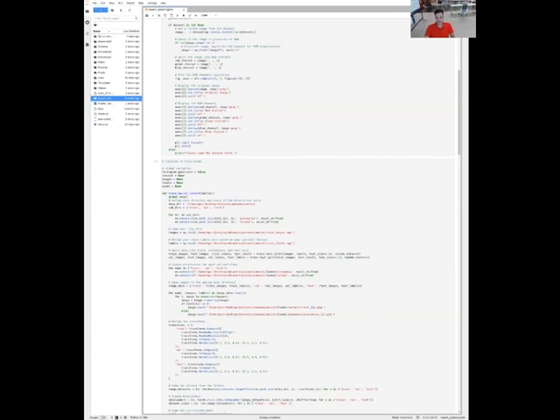So the section begins, the train model begins by defining the data directory and creating subdirectories for the train, validation, and test sets. The pneumonia dataset consisting of images and corresponding labels is loaded from the specified path. Data transformations are defined with torchvision.transforms.Compose to normalize and convert the images to tensors. Image datasets and data loaders are created using the ImageFolder and DataLoader classes from torchvision.